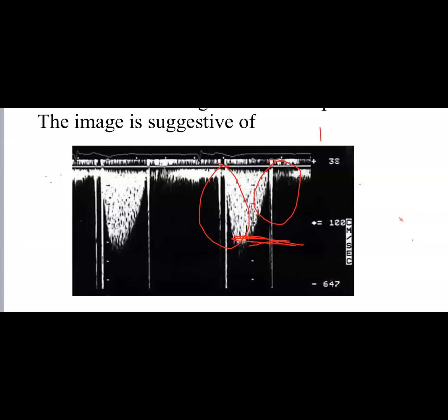So they open together and I have one flap, and they close together and I have one flap. So I am supposed to have a single metallic flap in the opening and on the closing. Now I have two during the opening time. That means I have desynchronous opening, meaning one is stuck. Stuck valve, exactly.